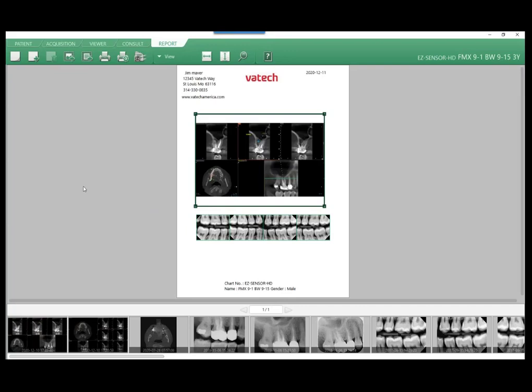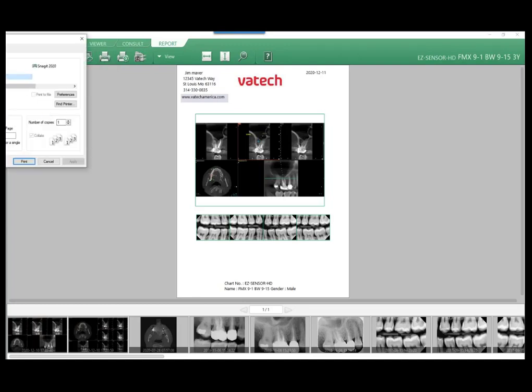Everybody wants this different. You can create this. All I have to do is click here, and I can move this around. I can resize my images here, resize my information. Once you have it sized, it is going to stay on that computer, specific to that workstation. So you have to go back and change it. Off to the top, we have our different tiles. New report, adding a page. We want to get rid of the report. We can add images. I'm going to go through these, add a text box. Our print functions are, which printer are we sending this to?